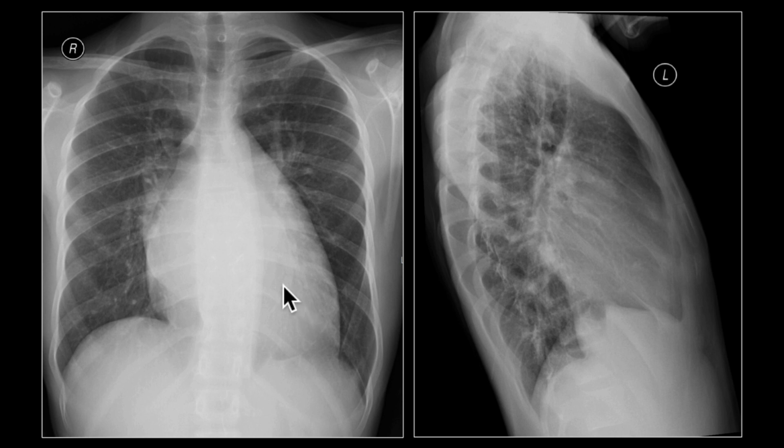For pulmonary edema, at a first glance, a junior eye might think that this is a normal lung. However, for seniors, especially those taking the examination, you know that dilatation of the left atrium is commonly associated with various stages of pulmonary edema. And you know that the earliest stage of pulmonary edema is known as pulmonary venous congestion. Let's stop here for a while and talk about what's normal.